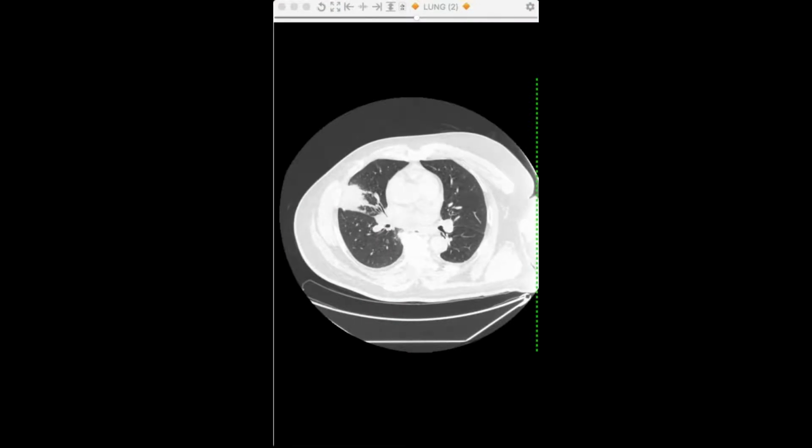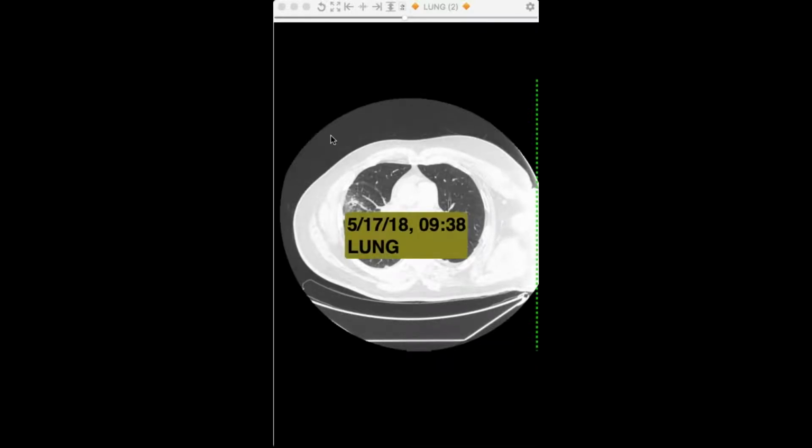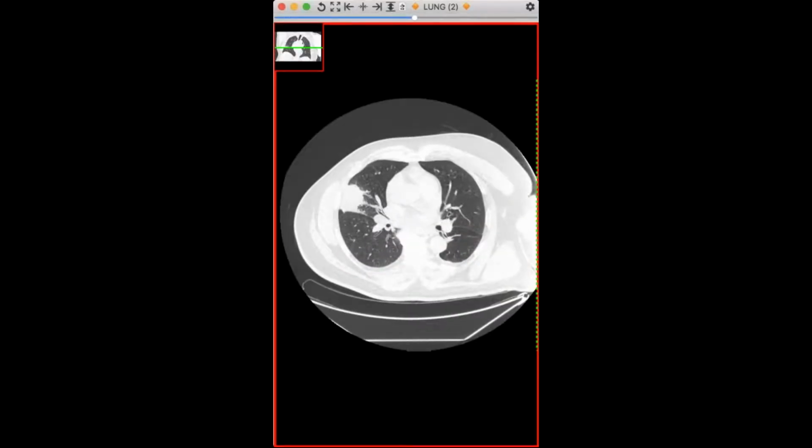I'm going to get these in order here. So this is the newest scan. I think I have to switch these two. Yeah, here was the original presentation. So I got them out of order. So this was the original, the follow-up, and the subsequent. This was biopsied and came back as small cell lung cancer.